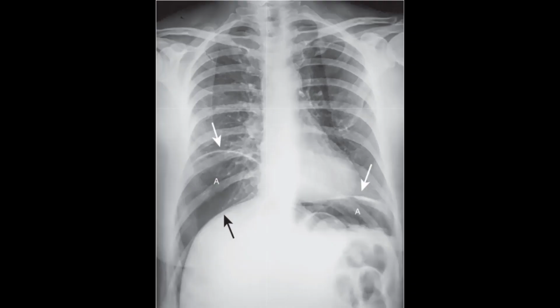The more air we have inside of the peritoneal cavity, the wider these spaces under the diaphragm become. And you can see on this image the tiny diaphragm marked with the white arrow and a wide space filled with air just under it. The black arrow on this image indicates the liver. The opacity of the liver allows us to visualize the collection of air easily, which is just above it here.